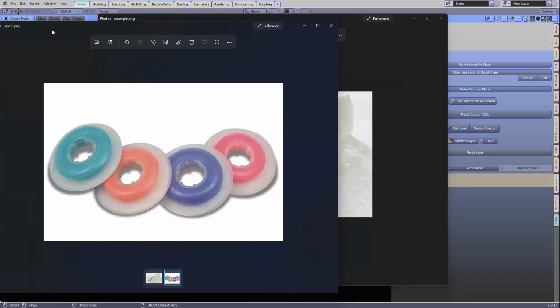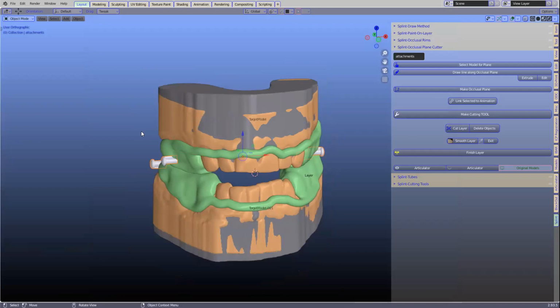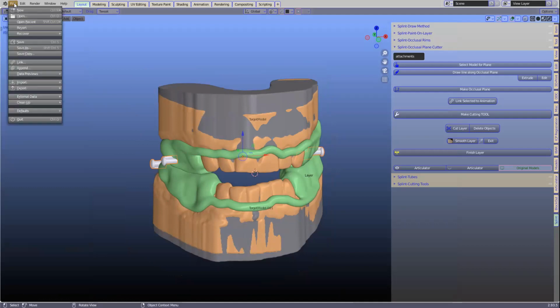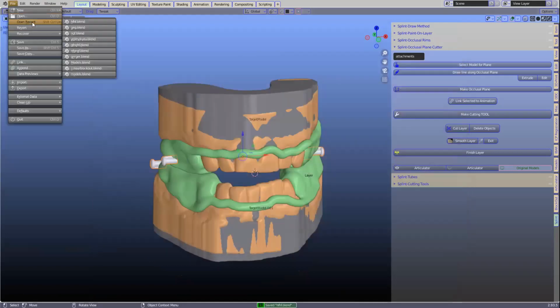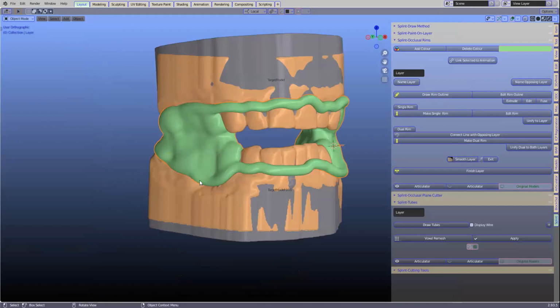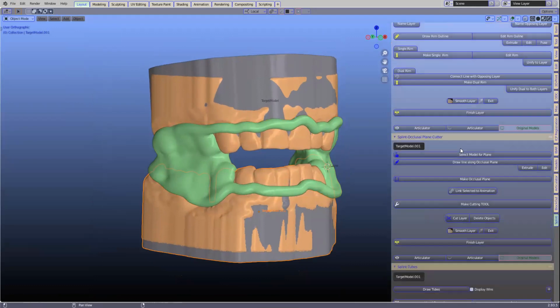Yeah. There was a question, Michael, whether a flat occlusal plane cut would be beneficial for protrusive. Yes, for protrusive, a flat plane. Yes, you can make a flat plane. I don't know if I've got this saved. I'll just go back a step. Maybe you could also use the Monson curve that we've got, Michael. Yeah, no, I've got it saved. I'll just briefly go through and show how it works.